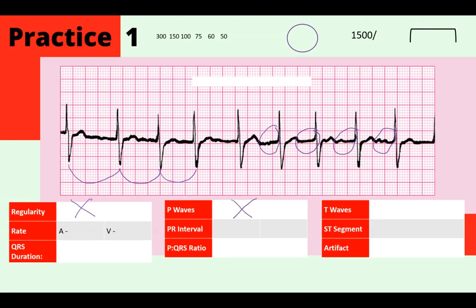In fact, what I see, if I were to draw it, is an irregular squiggle. It's something that a 6-year-old could draw. So for me, I'm going to say this is a potential lowercase f wave, potential fib wave. Do I see T waves? I do see some T waves here. They're not all uniform, but they are upright when they are present. So I'm going to say that's an okay looking T wave for now.